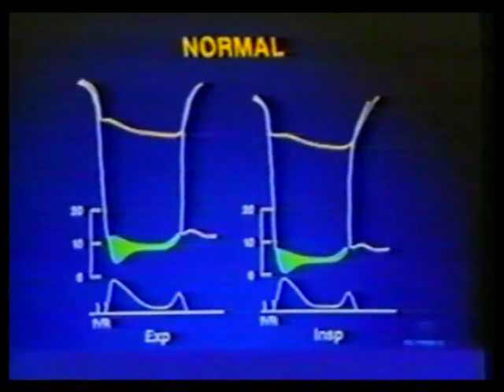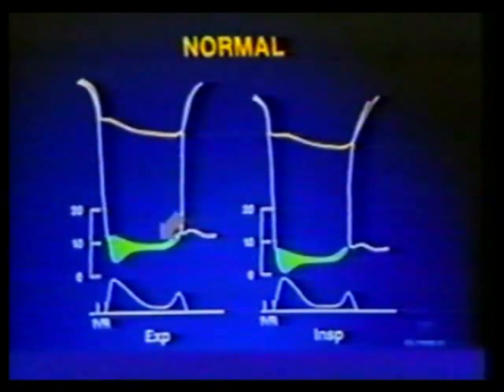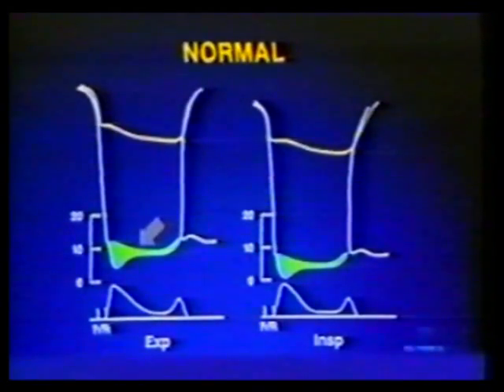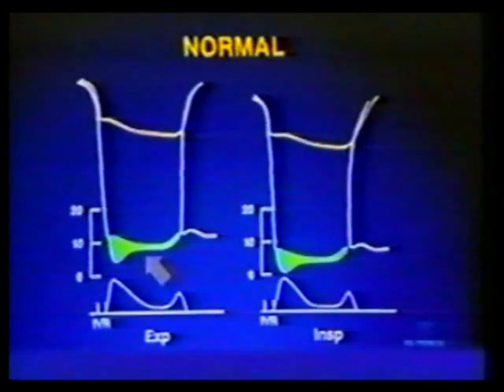Using pressure curves from the catheterization laboratory, the pulmonary wedge pressure, which corresponds to pulmonary venous pressure, falls from expiration to inspiration. However, the left ventricular diastolic pressure shows a similar fall. Therefore, the diastolic filling gradient between the wedge pressure and LV diastolic pressure shows little change from expiration to inspiration. Since this gradient determines the mitral velocity profile, the mitral flow velocity integral is also unchanged from expiration to inspiration.